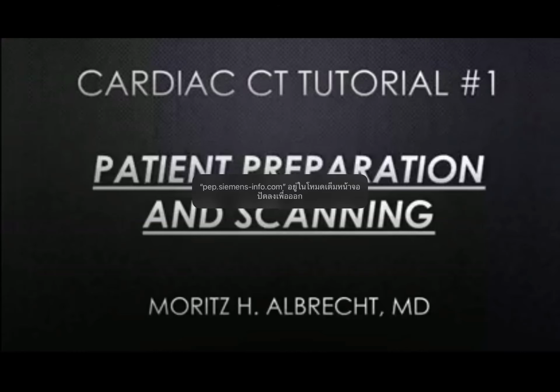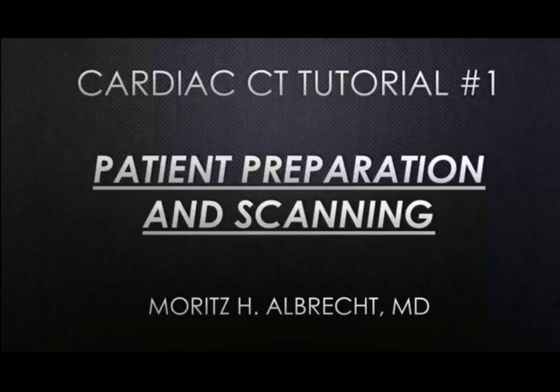Briefly through the most relevant aspects when it comes to cardiac CT. And importantly, at the end of each video, we will go together through real cases. So you will also see practically and hands-on what I'm doing when I'm analyzing real coronary CTA cases. And this will help you also to reproduce these techniques and apply this to your own patients at home.